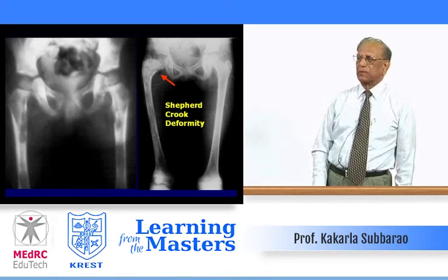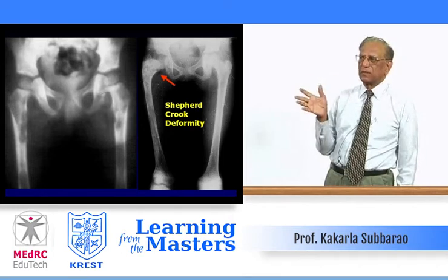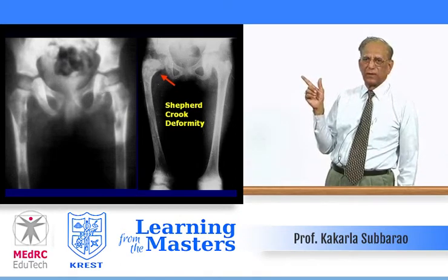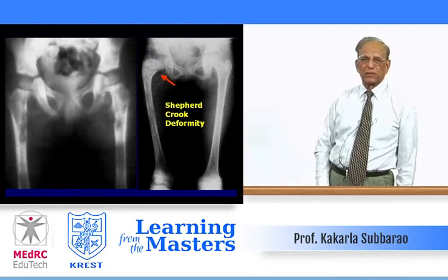For example, take the pelvis and the proximal ends of the femora. There are lytic changes, bilateral, although not symmetrical. Particularly look at the neck and shaft of the right femur on your right side. This is described as shepherd's crook deformity. Occasionally you may see fractures also.